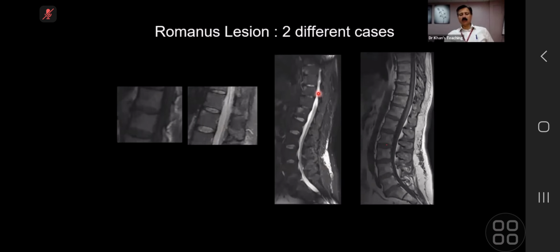Another point to remember is that this is STIR. Now you have to develop your eyes to say that this is a STIR sequence, and this is not a T2 weighted sequence. There is a bit of difference there, and if you look on your PACS and see how a STIR looks and a T2 looks, look at the cord. This is always a fat saturated sequence by definition, so there will be no fat. So this is a STIR sequence.